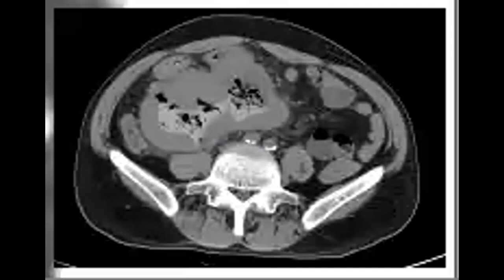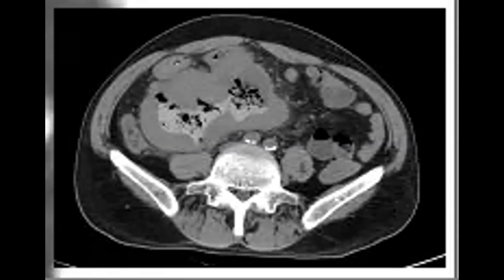I don't know if it's an obvious, clear image or not, but you'll find there is aneurysmal dilatation. Then there will be dilatation, even with no obstruction. There will be aneurysmal dilatation. Excellent. Yes, bravo. In the chat, yes. So this is a typical feature of lymphoma.